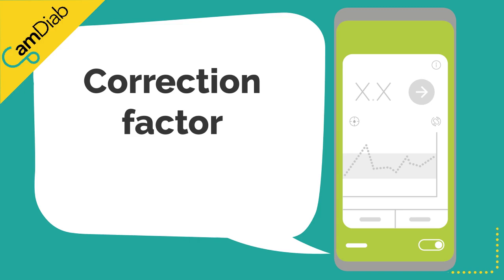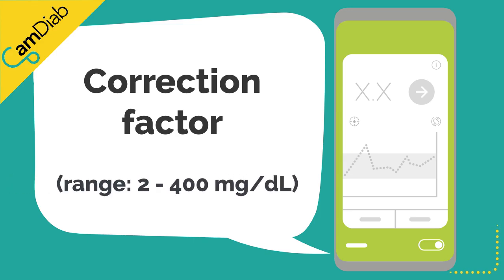5. The correction factor. This correction or insulin sensitivity factor is only used to calculate the insulin dose when a manual correction is requested by the user. This value does not influence how the algorithm calculates its own insulin delivery.